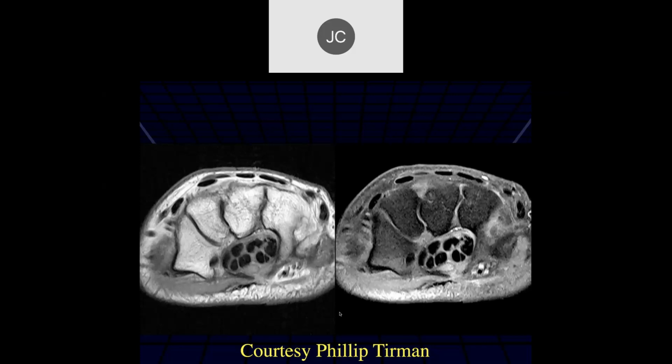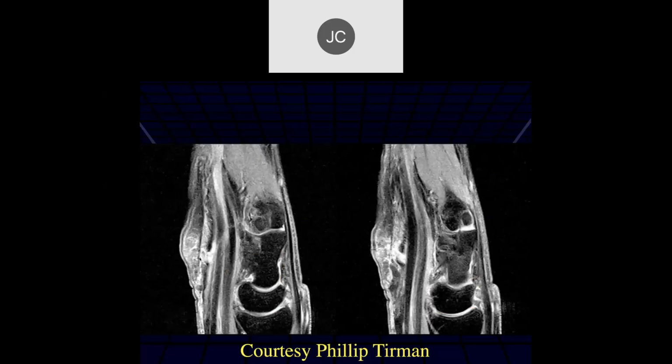Sure. So here, looking at the carpal tunnel, the median nerve looks maybe a little bit thick and increased in signal, but not too dramatic there. Yeah, looking at the flexor retinaculum, there may be a little bit of discontinuity there. Okay, so this looks post-operative, right? Yeah. And then here we can see interruption of that flexor retinaculum, but this was actually due to laceration by glass.